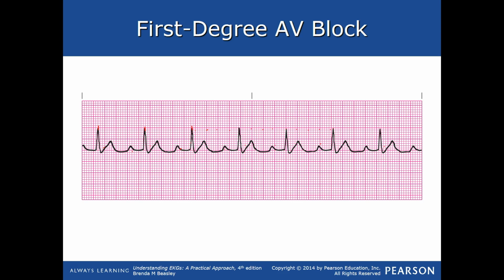upright and uniform. And then we look for a PR interval, and that's where we find the difference. We should have a P wave right around in here, but we see this is our PR interval here. So as you can see, that's a pretty long and extended PR interval. We're looking at what, 0.24 probably is what we're thinking that might be. And then our QRS is pretty normal. So 0.24.